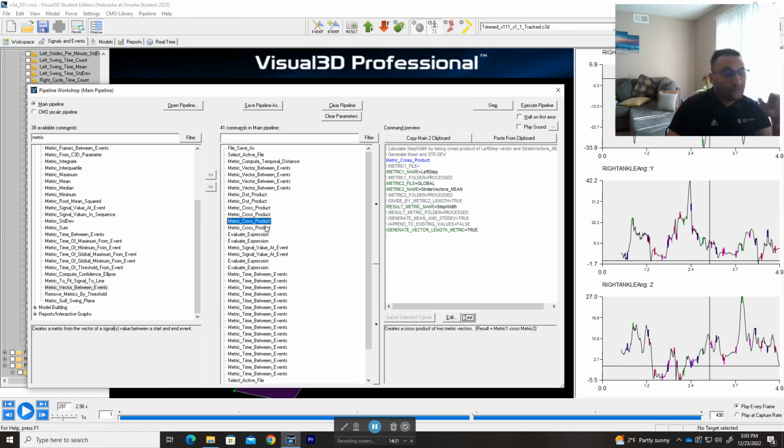And if you're wondering what's happening here, once we get the right step width and the left step width, we extract the step width for all the left steps, and then we extract the step width for all the right steps. They never interfere with each other, because it's right, left. So you're basically filling the gaps between both. And that's how we did it.